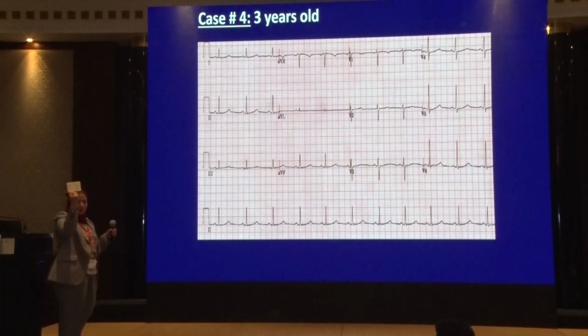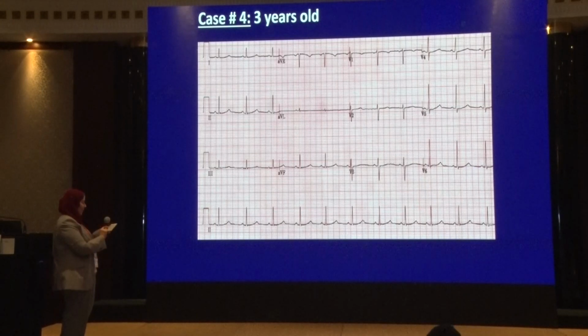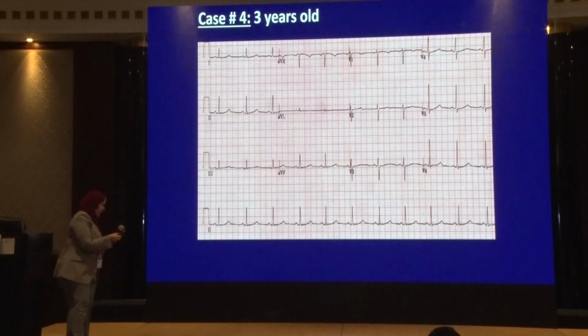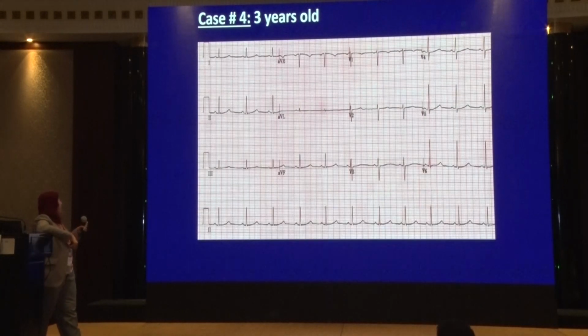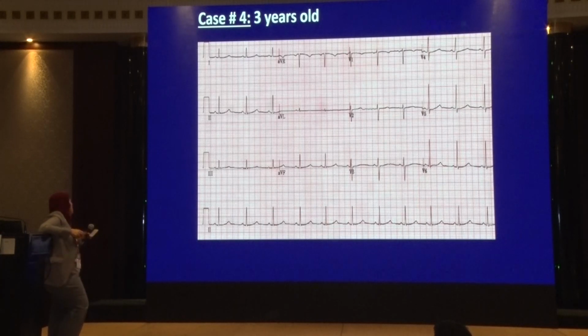We will go to the chart and look for the age. 3 years, it should be from 73 to 137. Okay, so the patient is bradycardic. Then after that, we will go for what? Is it normal sinus rhythm or not normal sinus rhythm?